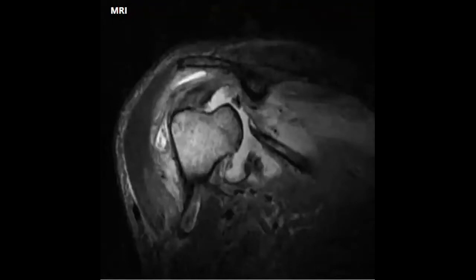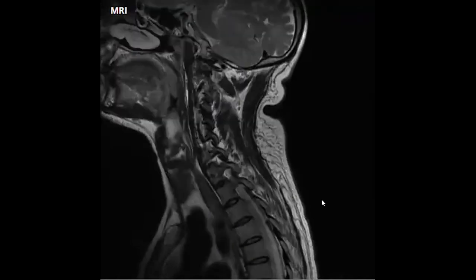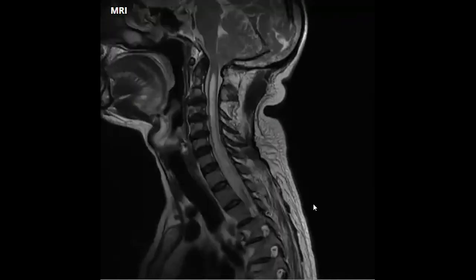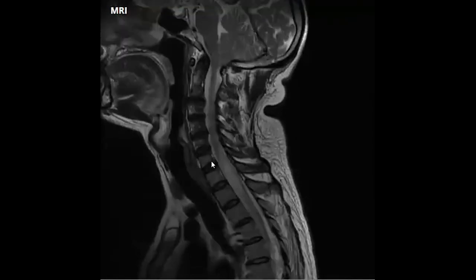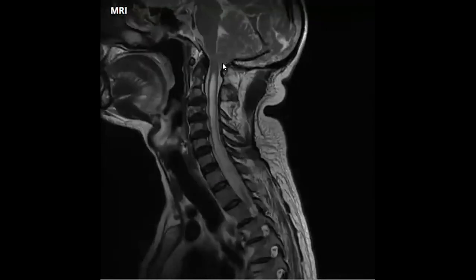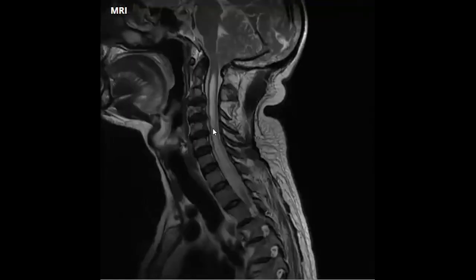If you think about Charcot, yes. So this is exactly it. So what is going on here in the cervical spine? Why do you ask for the cervical? Yes, Dr. Ghada, yeah, there is syringomyelia. And if you check also the cerebellum here, there is some sort of descent. What is it called? Tonsillar herniation. You remember the rule when we talked about syringomyelia?